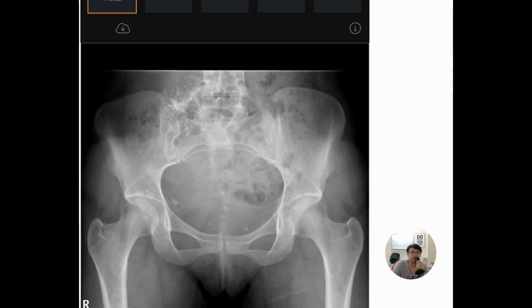Do notice that the pelvis is a very classic radiograph for you to compare both sides. Without comparison, you simply cannot detect the lesion here, okay? It is really not something we expect to see, but by comparing both sides bit by bit, you will see there is added high density with a cortical component and also a trabecular component. So there is an ossification projected above the right sacroiliac joint.